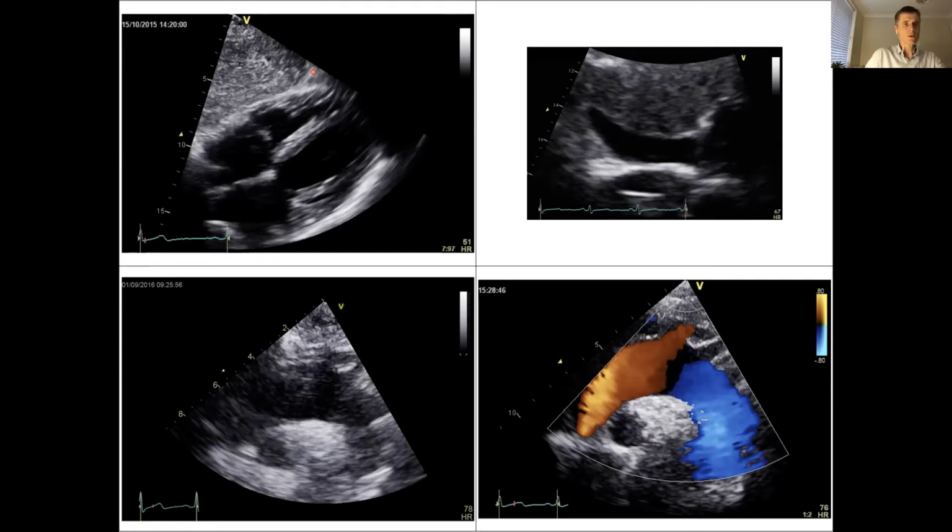So there are some of the features of the right atrium that I want you to notice for the moment. There are other features that we'll need to get used to as well, but that's what I'll get you just to appreciate for now.